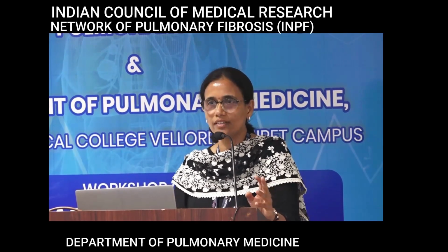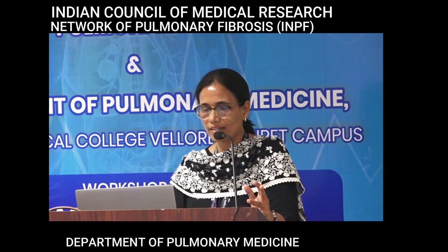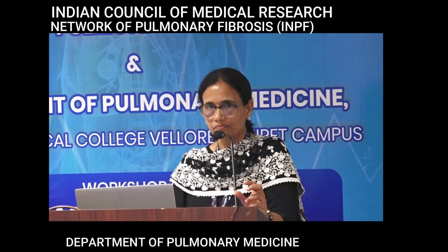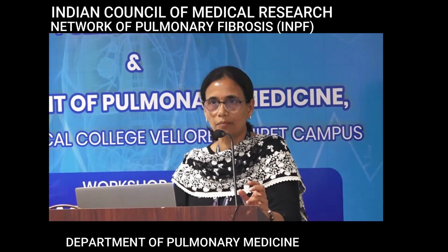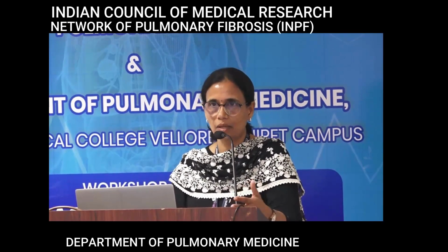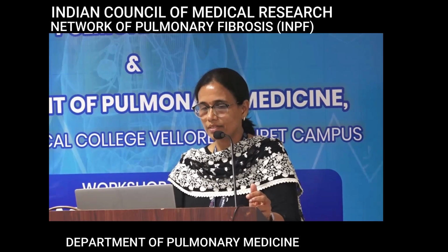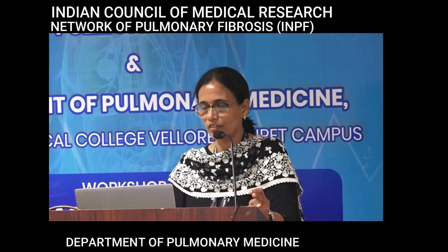So what are the three densities? There is normal lung, there is ground glass density, and there are areas of air trapping. So those are the three densities, and this air trapping can have a lobular shape, like the shape of the secondary pulmonary lobule. Previously the same thing was described as head cheese appearance, but now the preferred terminology is the three density sign. So that brings us to the condition where we see the three density sign, which is hypersensitivity pneumonitis.